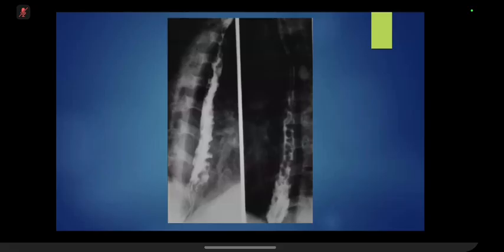And here I can see that there is mucosal irregularity, mainly involving the mid-lower esophagus. There is, however, no obvious stricture which I can see in the images which have been provided. There is no dilatation or pooling of contrast seen anywhere.